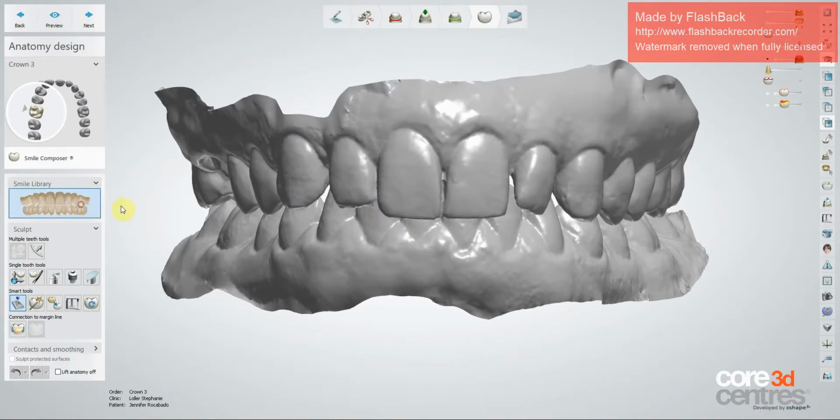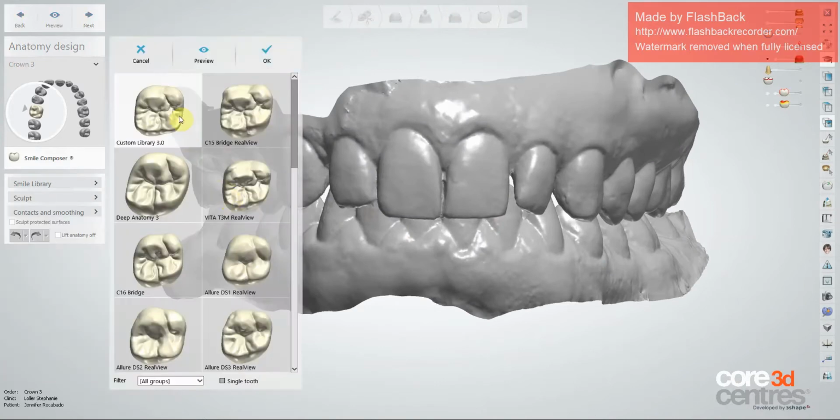The next thing we're going to talk about is my library. It's mine, but it's really what it is. I took 3 libraries in 3Shape and I idealized them. I spent about 4 years worth of research, 4 years worth of design experience, and put them into what I wanted in a perfect library. And then I created that library and I use it for everything. Not because the others aren't good, they are, but I got one that I like, that I'm constantly tweaking, constantly updating, and I like it. And the people that I design for really like it also.